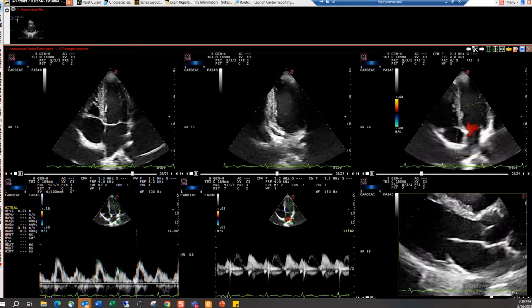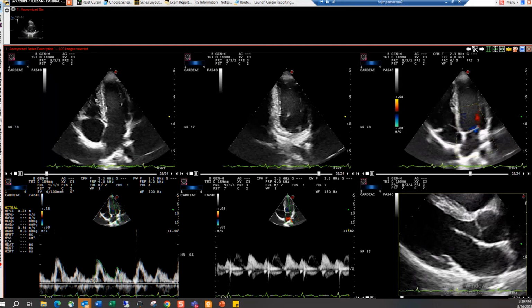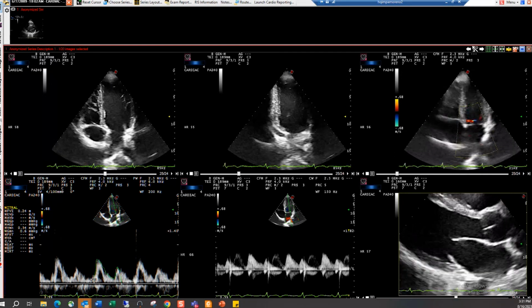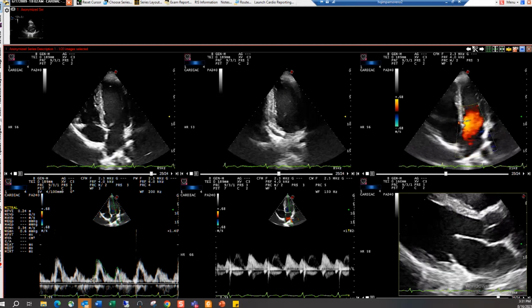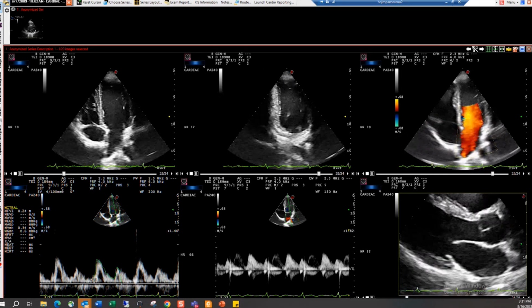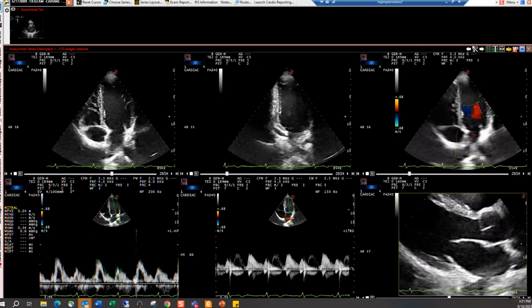And then it will highlight if it's outside of that particular range. Dr. Scott will show you some of those. We have the diastology flow parameters in there. So instead of having it posted on the back of your desk or somewhere in your reading facility, you can just pull those up in Encapture MD.